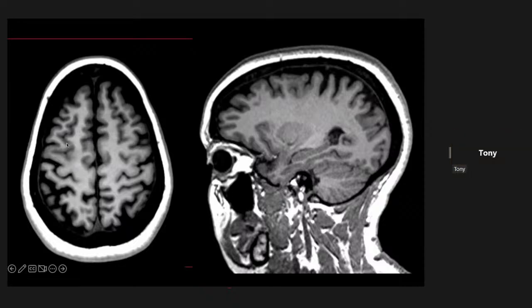Okay. Right there. When I'm comparing side to side, yeah, it looks, I guess, it's blurring a little bit. Yeah. It's terrifying, isn't it? These are so hard. These are so difficult to see. Yeah, and maybe a little bit of cortical thickening through there, maybe a little bit of white matter blurring through that when we look at it in the same spot on the sagittal view.